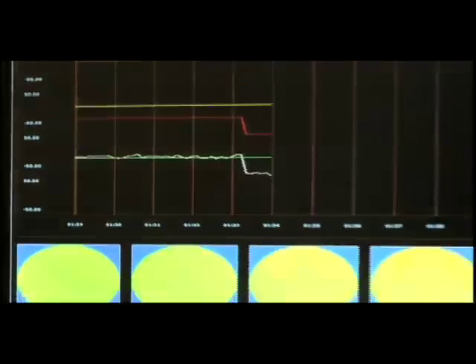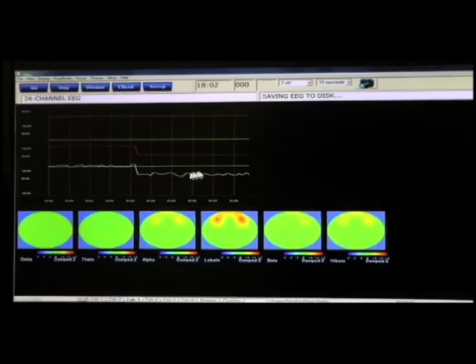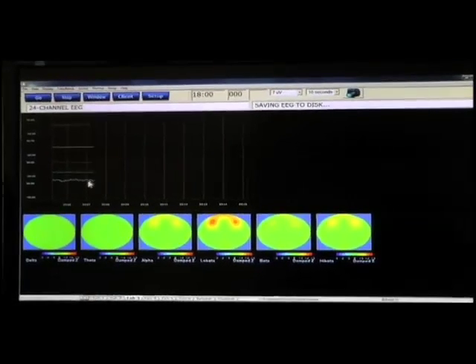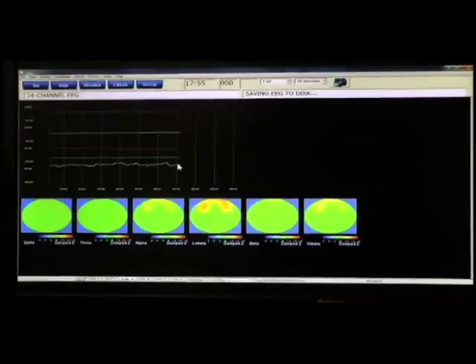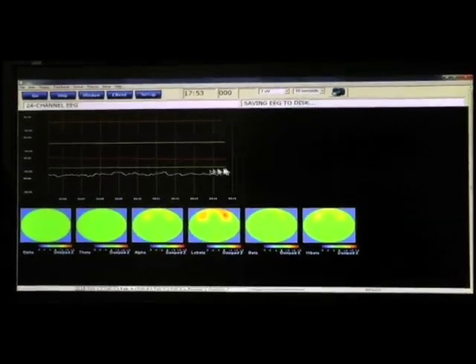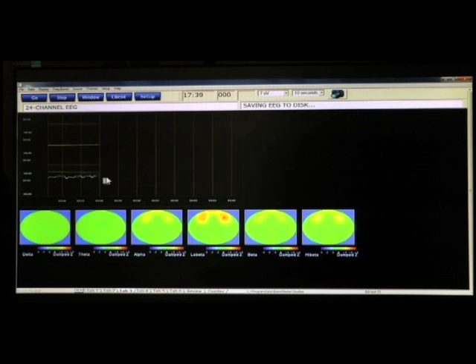And then if I look at my other tab, I see here's the point where, look at, obviously less Z-scores. Now again, remembering that this is a simulation, fewer Z-scores can fall within the range of ±1 than when we were at ±2. We were up at this green line before. Okay, but I can simply adjust that green line by going Shift C. See how it starts coming down? And then here we are, and as I continue to hit the Shift C, I can bring it right down to meet that white line.